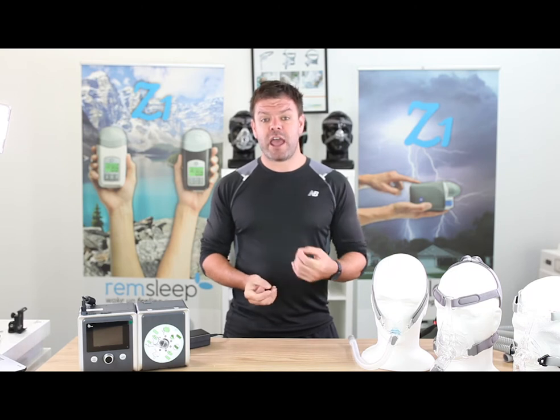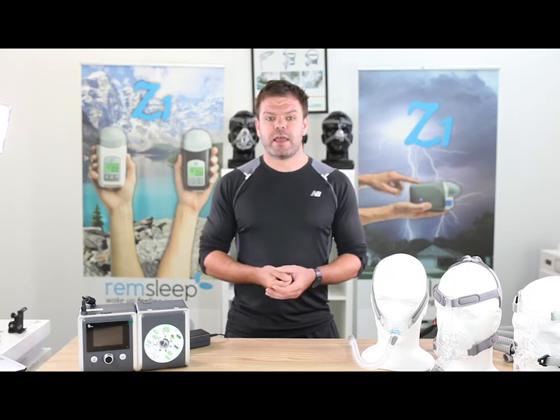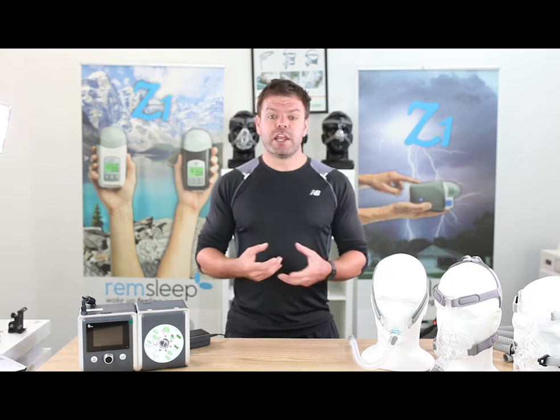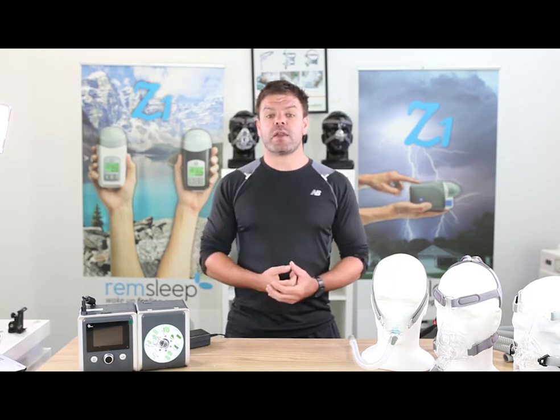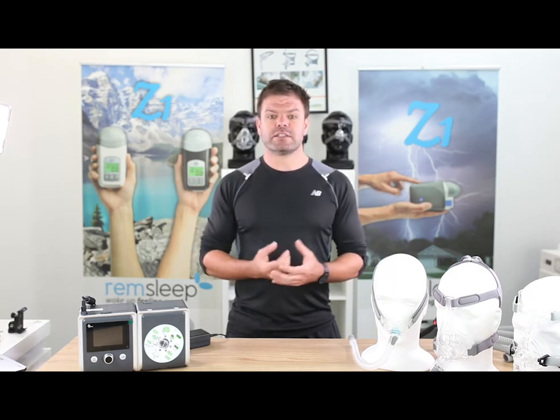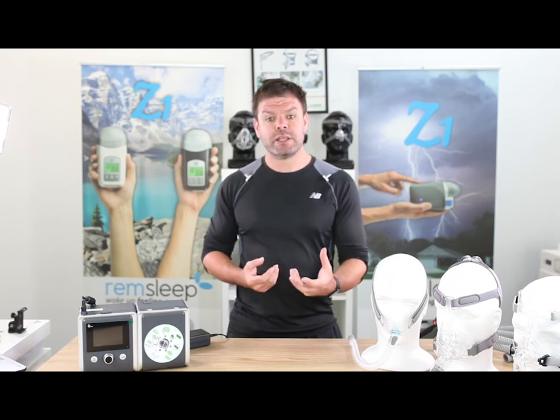Snore index tells us how many snores you're having per hour, similar to the apnea-hypopnea index. And the last one is leak rates. Leak rates tell us how much air is escaping from the mask. A little bit of leak is unavoidable, however too much leak can start to cause problems with noise, and it can start to cause the therapy to be less effective.